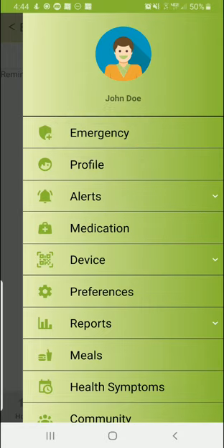You already have some people in the emergency contact list, which includes your doctors and your family. Using this emergency contact list, you can connect them with whatever medical condition, all the measurements you have taken which have alerted you, and those measurements will be transferred to those people through emails or text message. This is not implemented yet.